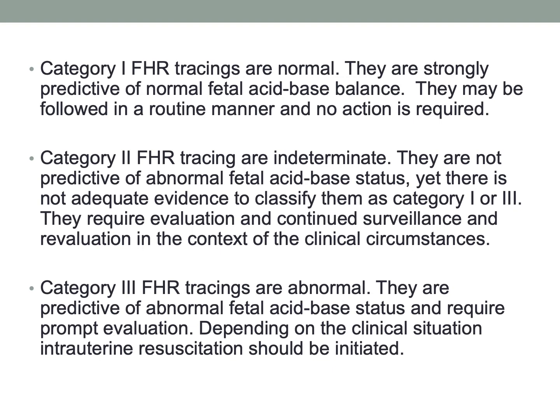Please understand there's different types of category 2s. You might have a category 2 that almost looks like a category 1, okay? This is that perfect strip with accelerations and variability, but then boom, you had 1 variable. So because of that 1 variable, it stops being a category 1 and it becomes a category 2, all right? And then that's a good category 2, right?